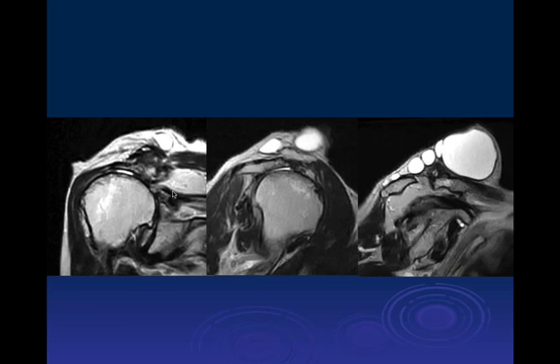Okay. So what we see here is a complete tear. Here's the supraspinatus tendon, marked atrophy of the supraspinatus muscle. So this is a chronic tear. No cuff going between the acromion process and the humeral head. Superior migration of the humeral head, marginal osteophytes, denudation of the articular cartilages, and then we've got a lot of hypertrophic degenerative disease of the acromioclavicular joint.